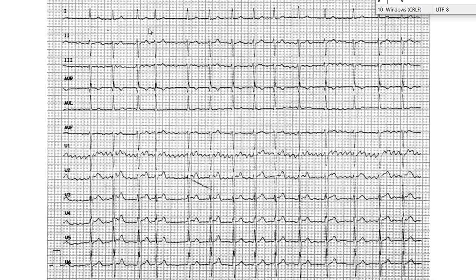However, that thing doesn't look like an extrasystole, because there's no difference between them. You might argue that it might be an extrasystole. It is feasible, but this definitely rules it out, because here we see fibrillation, and fibrillation doesn't have a regular rhythm. So we just do a backwards operation and say, oh, we always thought it was an irregular rhythm, so we'll just work with that. All right. So anyways, point 1, we'll say irregular, especially because this thing is popping out. Fair enough. Point 2, we say sinus or non-sinus.